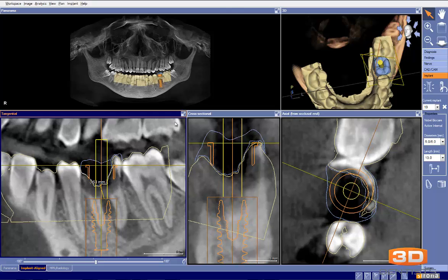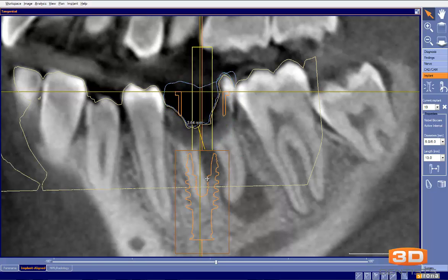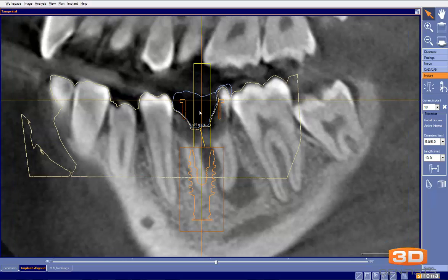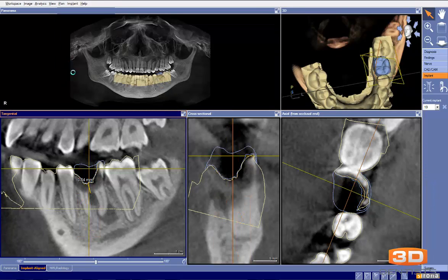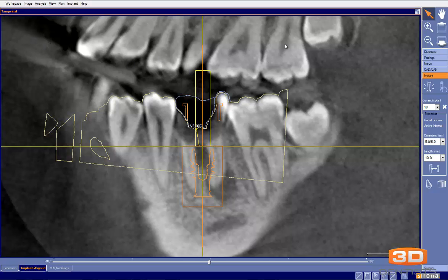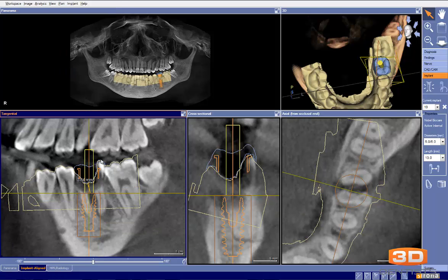If anything, one of the things I also remember, we use the occlusal plane as a guideline. One of the things I want to take a look at here is my emergence, just like so. How will that look? How will that be in terms of being able to build that? And again, that looks like a pretty good one. If anything, we could say that this implant needs to move over a little bit, so we probably move it over to be a little bit more centered, and then doing that we'd have to tilt it back, and that would make our occlusal plane slightly off. But in comparison, we can compare our occlusal plane here in the submitted plan. Again, you can see how the teeth are moving at that angle there, and compare that to the modified plan, and we can see the difference there.